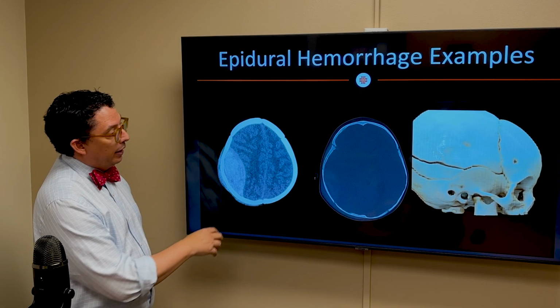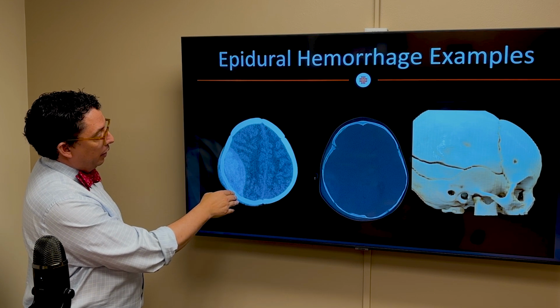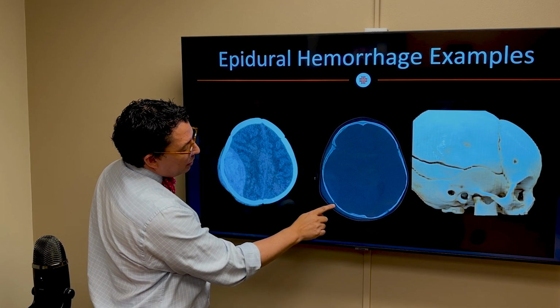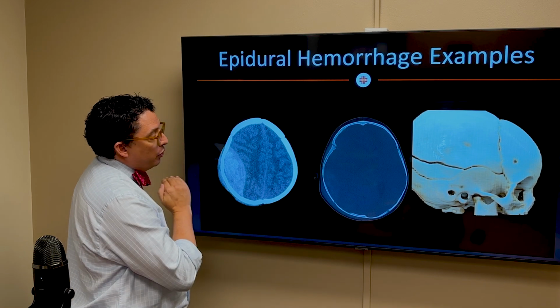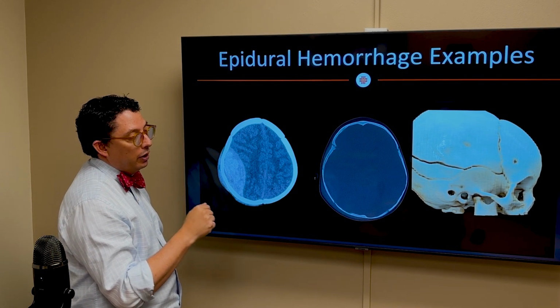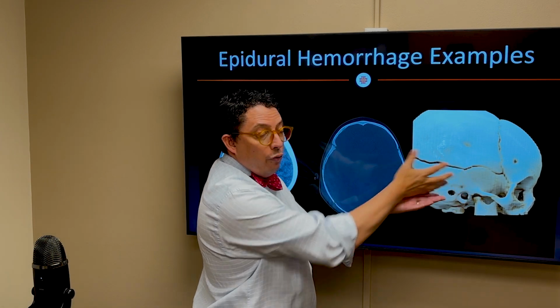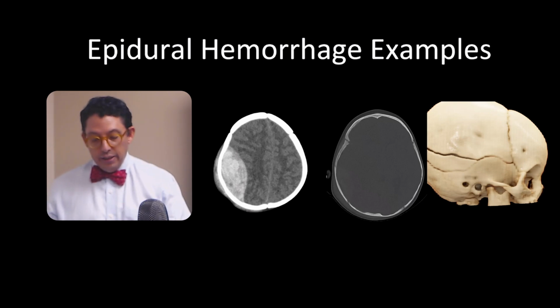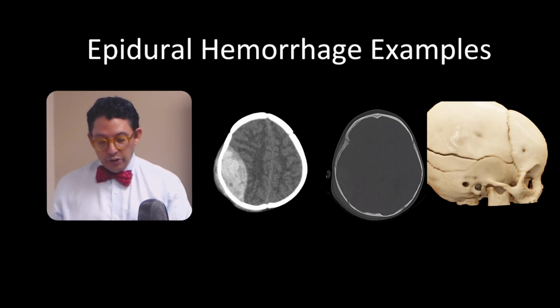This is a kid that came with this hematoma. We did the CT. We could not see the fracture. Is there a fracture or not? When the fractures have the same direction as the slices you're cutting, they're very hard to see. But since we can now make these beautiful volume rendered images, you can see in the volume rendered image that there's a fracture exactly in the same plane as we're scanning. There's an acute fracture with an acute hematoma in a kid.